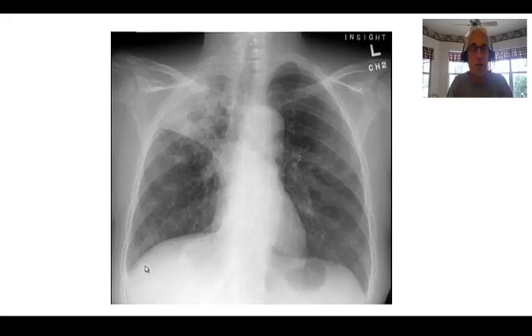Here's a patient who presents with a fever, weight loss, night sweats, and some hemoptysis, bloody sputum. The airway is a bit pulled to the right. The bones look fine, cardiac shadow looks fine, diaphragms look good. There's no effusions, no free air, gastric bubble is present. And the hilum looks okay, but look at the interstitium. Look at that massive infiltrate here in the right upper lobe.